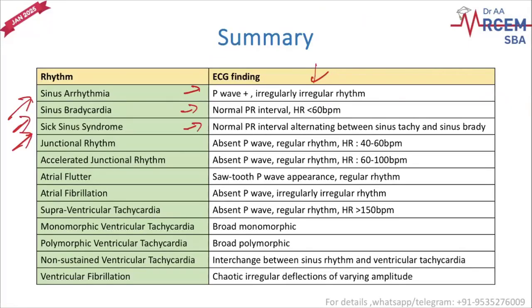Sick sinus syndrome. Sometimes you are having normal PR intervals, a normal rhythm, and suddenly there is no electrical activity at all. It goes into sinus tachy, sinus brady, alternating between the two.